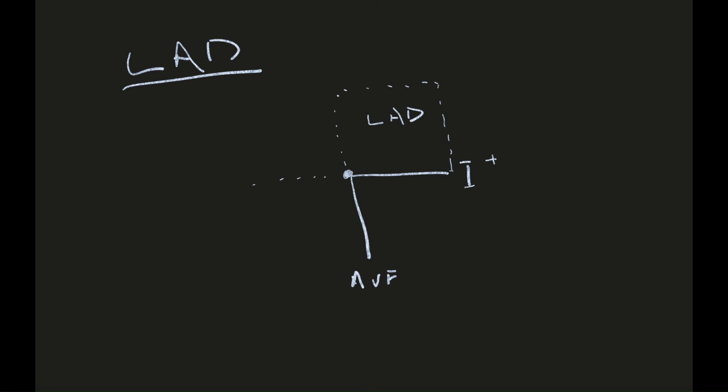This is the center of origin. In this area, which lead is positive, which lead is negative? This is the center of origin. AVF, if it will lie to the other side of origin, it will become negative. And lead 1, if it will lie on the opposite side of the origin from the positive side, it will become negative.